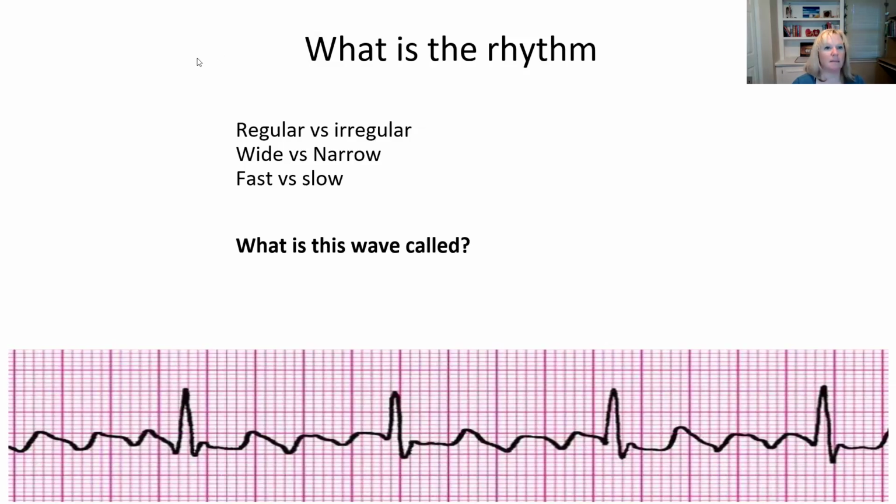So in the meantime, it is flutter. We knew that because of these non-P waves, these ended up being flutter waves, right? So flutter waves here, here, here, here, here. So these are not P waves, okay?